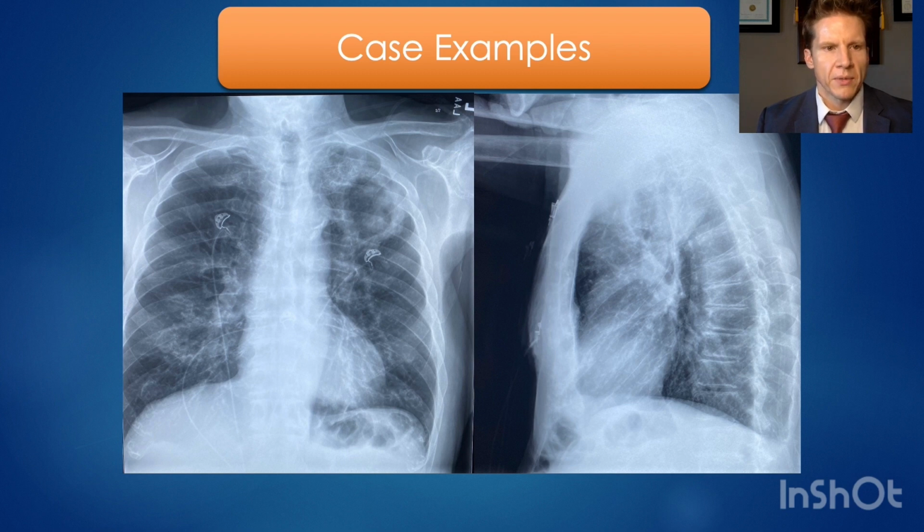However, when we get up to this upper lung zone, this area should stand out to you as being asymmetric. There is this rind-like opacity with central lucency and these fluffy areas of opacity and consolidation in the left apex. We can see corresponding abnormality on the lateral radiograph.